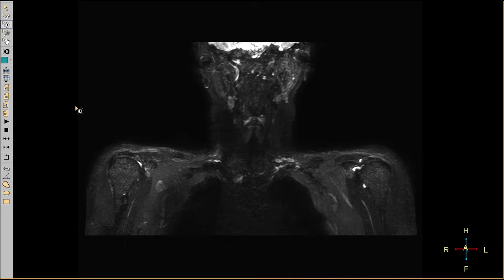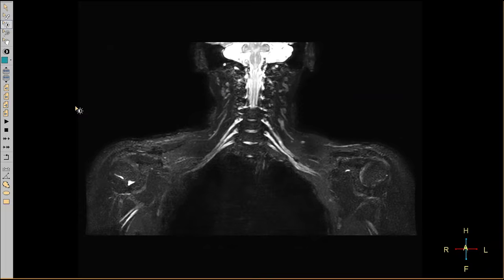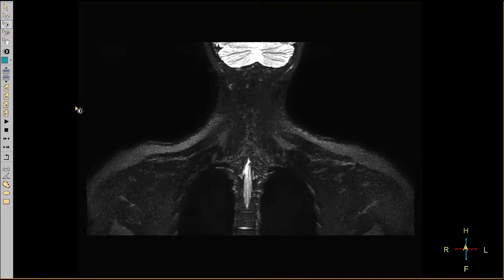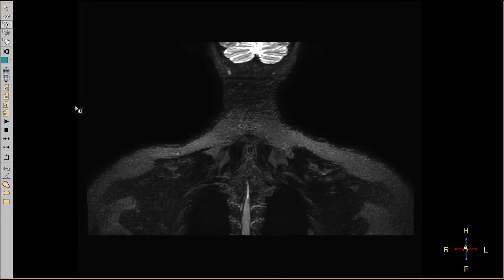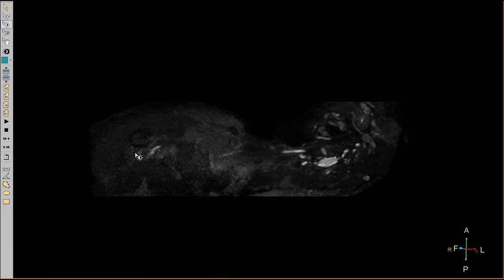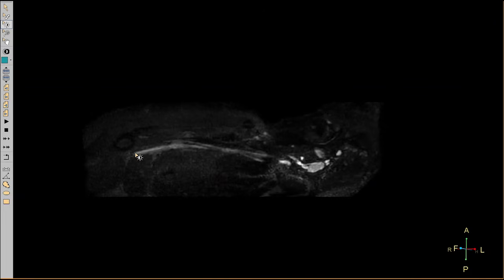So being able to suppress blood vessels, breathing, and all the background tissue with this 3D NerveView, you can see a very uniform set of nerves that go across both sides. So then we can be very confident that if we see an increase in signal, we know it's going to be something genuine. I can't tell you how excited the referring surgeon was that we were able to show exactly not something that just matched the story, but something that was so well defined.